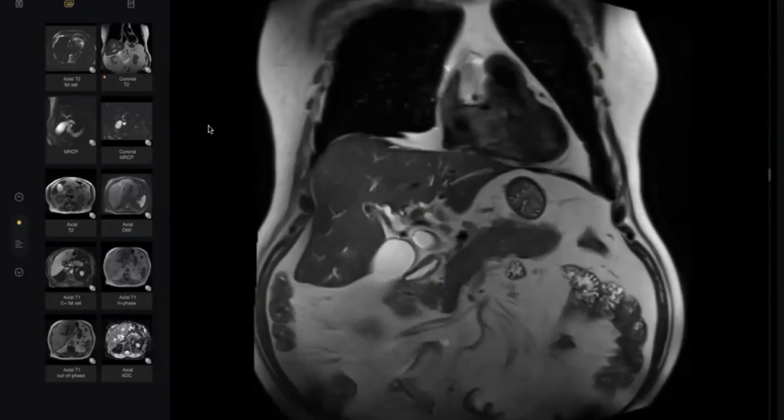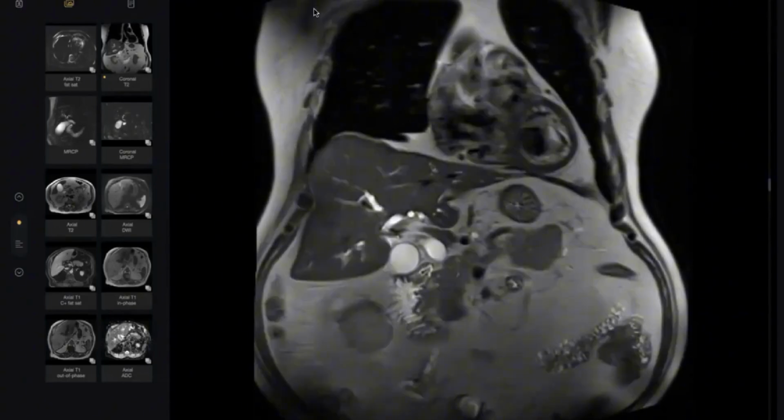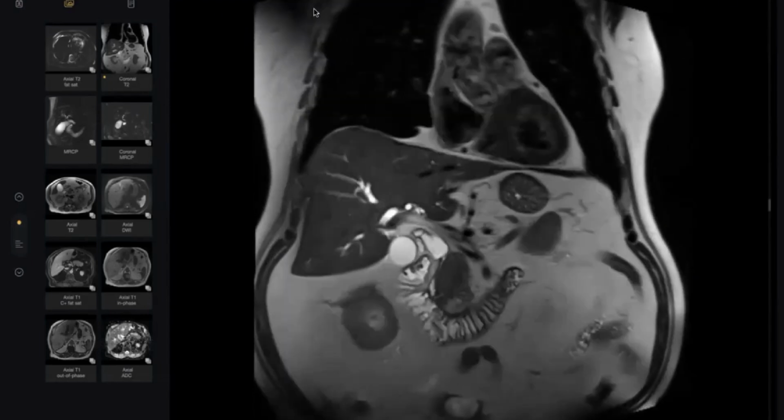Okay. So I'm looking at this one. Do you remember the patient age? I think so. Yeah, he was a young boy. He is young, but not so young. He's just 85. Not young at all. Oh, 85 years old. Very old, so an elderly male.